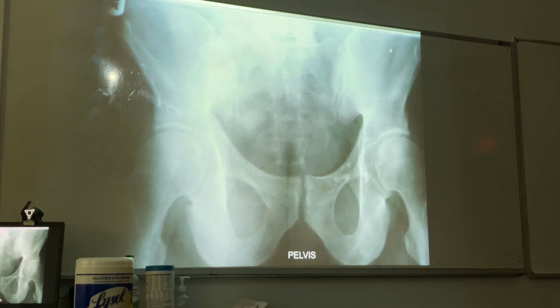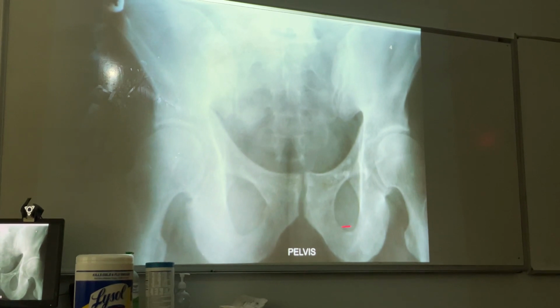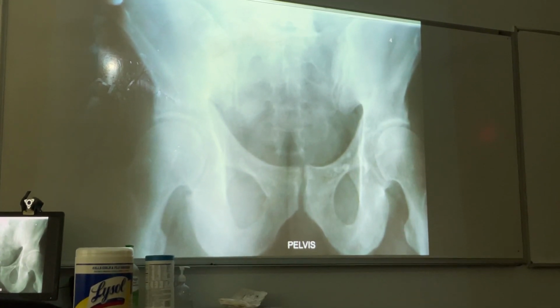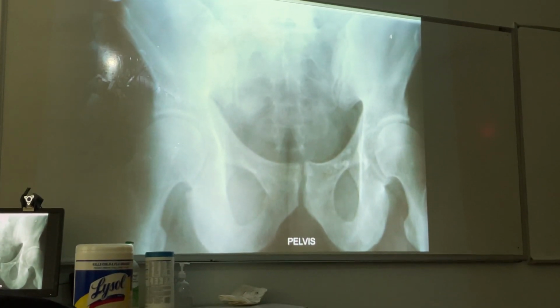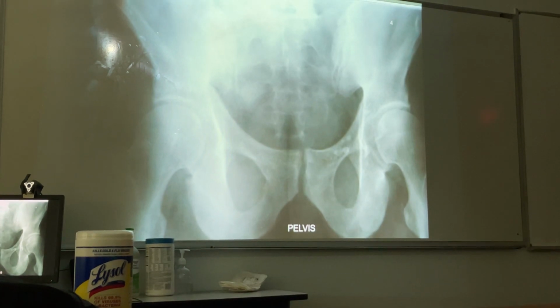Believe it or not, some people do take good X-rays, so well done. This is an example. Oh my God. Well, you've sat with me enough to know, seen all the trash. Being kind. Yes, sir. Okay.